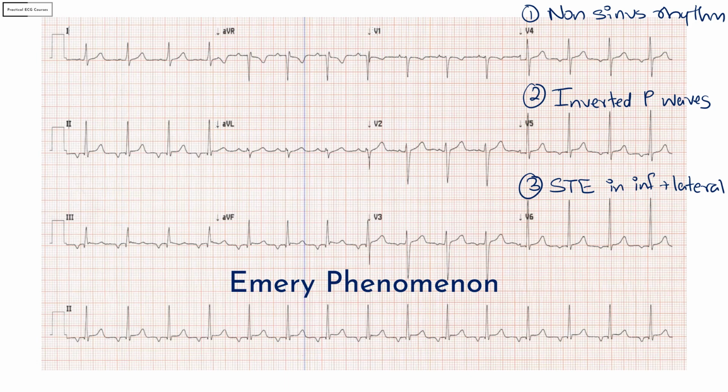So why is the ST elevation territorial then in this ECG? This is because the inverted P waves are territorial. I have already explained why the P waves are inverted in the inferior leads but positive in the high lateral leads. In the precordial leads, you can see that V3 to V6 has inverted P waves, and so they also can have ST elevation. And why is this knowledge important for A&E clinicians?